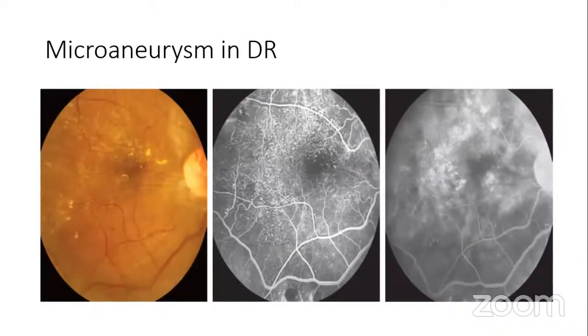Now, this patient has a lot of microaneurysms and telangiectatic vessels as well, the combination. So these are exudates in the patient. So you have to correlate what you're saying with the film. Okay. Now, see this here. You go all the way and look for what's going on. But this is a combination of telangiectasia and microaneurysm.